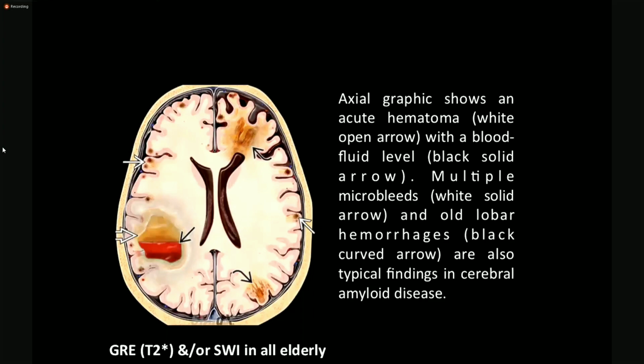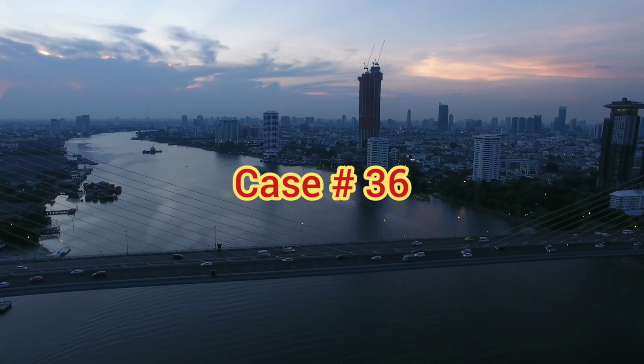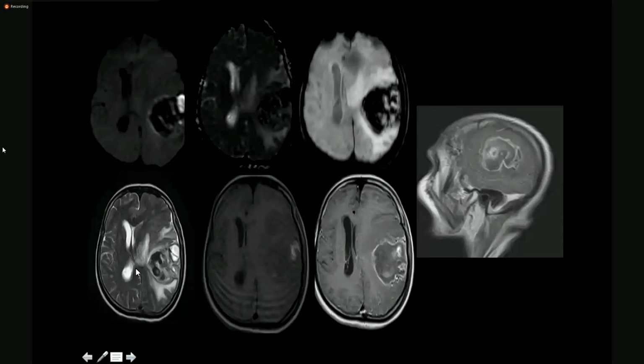This is an axial graphic which is showing acute hematoma with the blood fluid level at times, because there are various bleeds of various ages. There can be multifocal microhemorrhages in amyloid angiopathy. Diffusion, ADC, susceptibility weighted images.